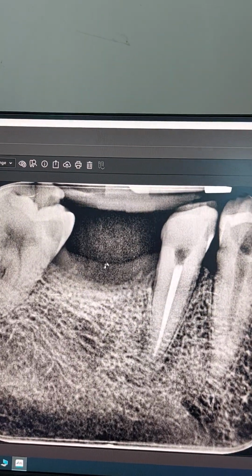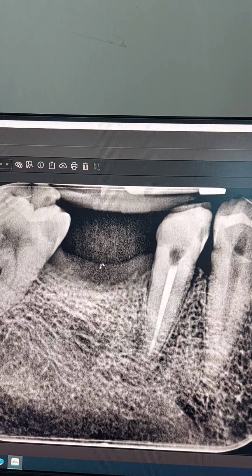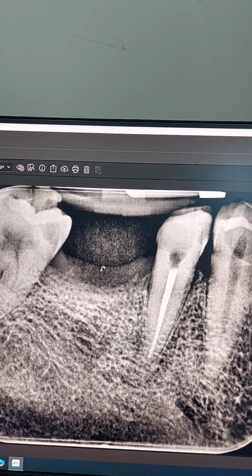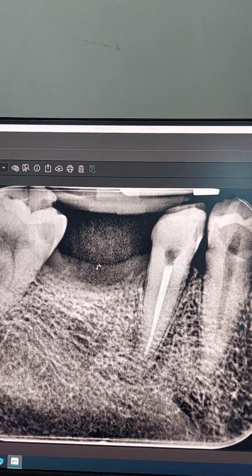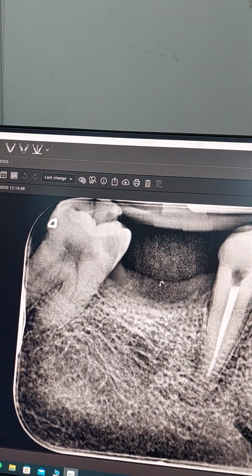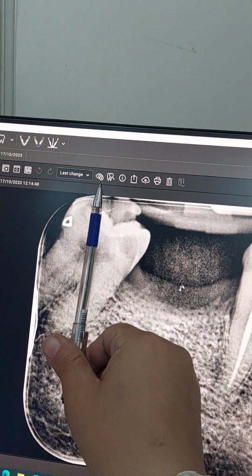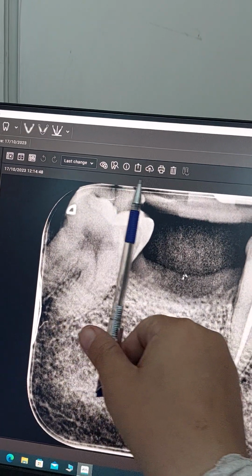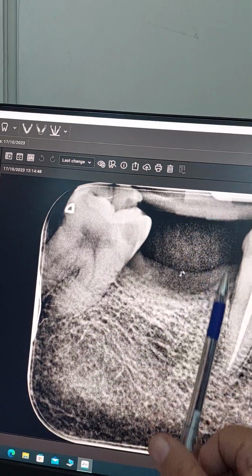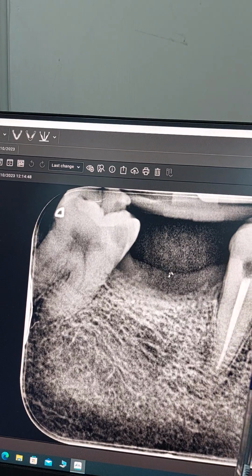We might replace the missing tooth with 2 premolars. Yes. We could replace the missing tooth with 2 premolars. It doesn't have to be a 6 morphology. Yes, we can do it with 2 premolars, especially if it's a bit larger than this space. Okay, so we were talking about the severely tilted tooth and how to identify the tooth. I would say this was an 8. This was its position originally, and this was all the 7 drifted, covering the 6, and look at the spacing. Look at the roots of the 5 and 4.